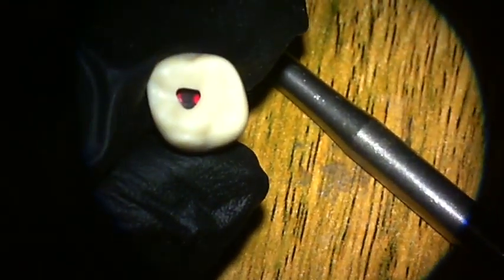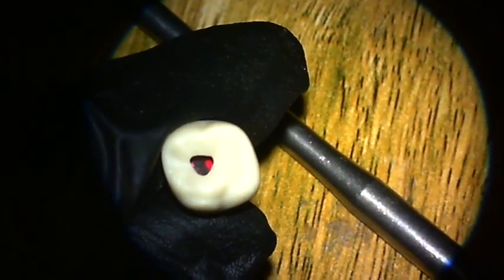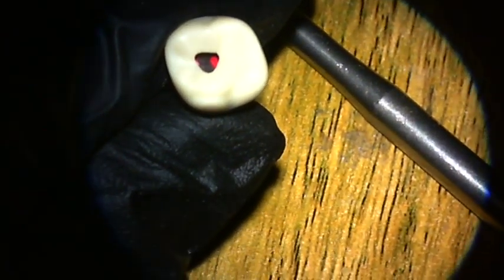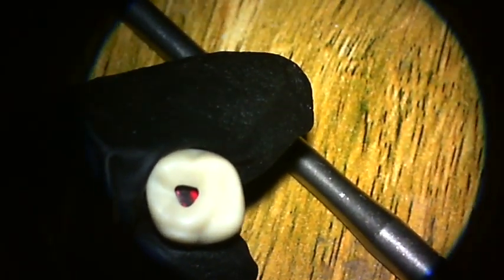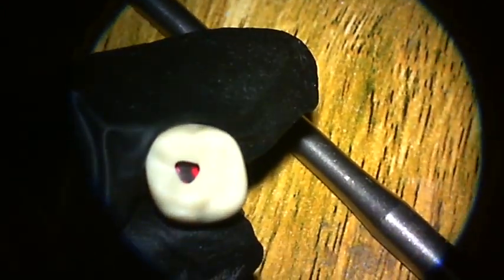The way to prevent that is that you have your burrs always inside the chamber when you're doing the cleaning or shaping. Damage to the gums, that is so unlikely to happen in endo access opening. Straight line access, we just talked about that. So you see with endo criterion, the criteria are interconnected.